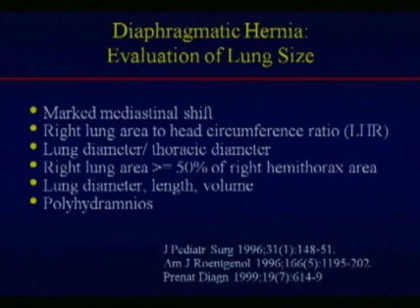One of the things that's very important to do when we characterize thoracic problems, when we characterize diaphragmatic hernia, is evaluation of lung size, as I mentioned before. With diaphragmatic hernia, it can be more difficult because we've got this large amount of mass, sometimes quite big, and it can be quite hard to distinguish the intestines from the lung itself.